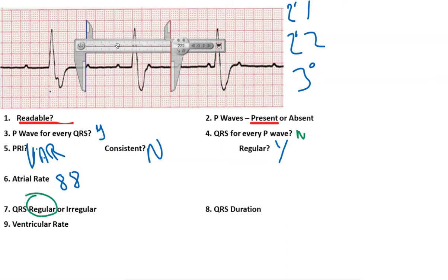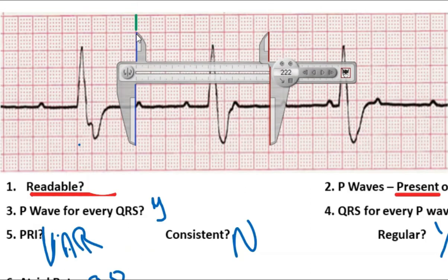And now I want to know what my ventricular rate is since I already have these set. Again, here is a QRS complex. It would be here. Here's another one that is here. And when I blend those two things together, I have a 300, a 150, a 100, 75, 60, 50. Now, once I get here, it really becomes inaccurate.